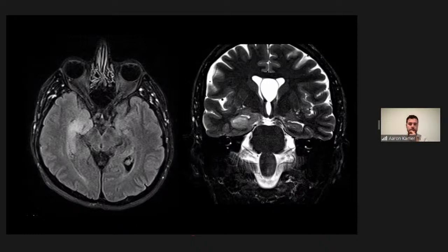And I actually love that you mentioned that. Mesial temporal sclerosis is a process that we see very, very commonly, and it's one of the primary things that we teach our residents as a cause of ongoing epilepsy. So I love that that's at the forefront of your mind as you think about this. One of the interesting things about this case, though, is that unlike most mesial temporal sclerosis patients, we're seeing, as you accurately described, some edema in that hippocampus, which would not be typical of mesial temporal sclerosis, which tends to be an atrophic process.